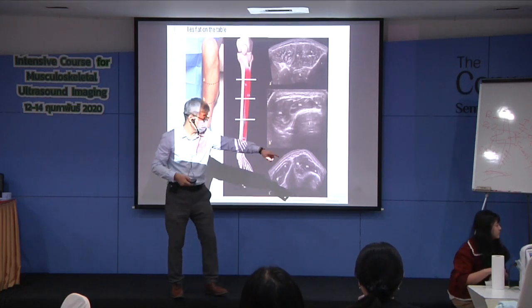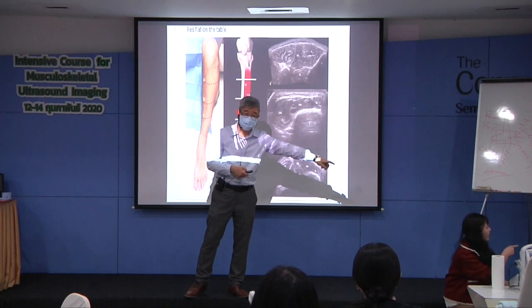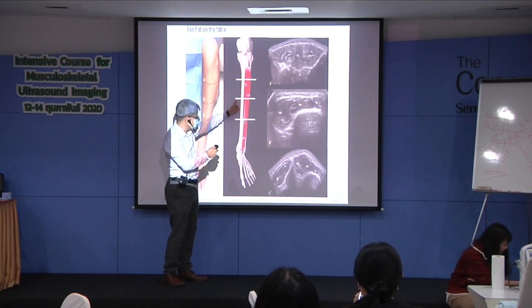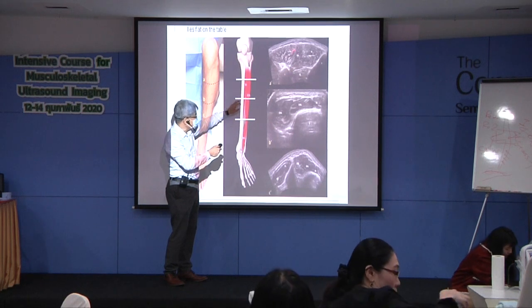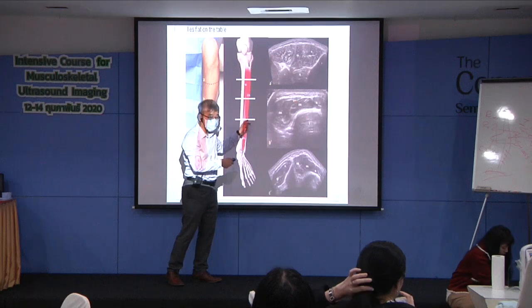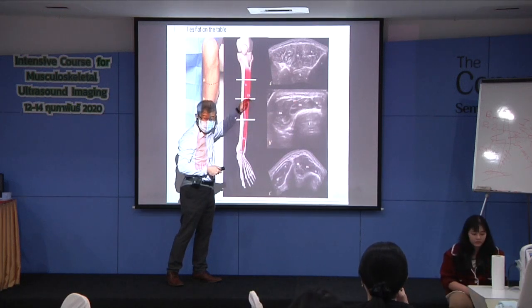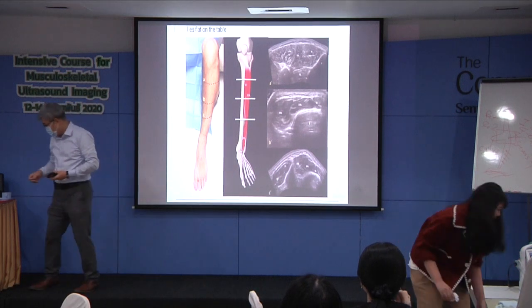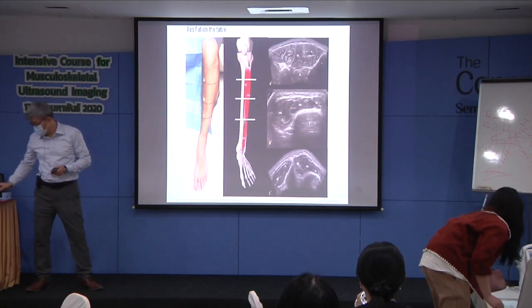She is more like a European. Her extensor hallucis longus cannot be observed in this area, but only in this area, middle, a bit low. Yeah, that's different. So the same scale.